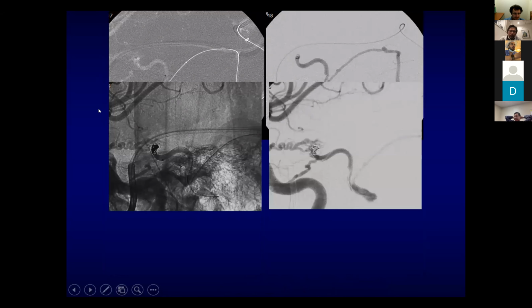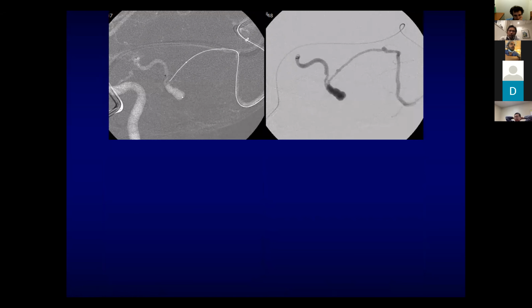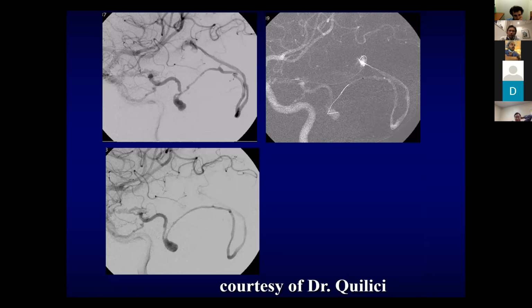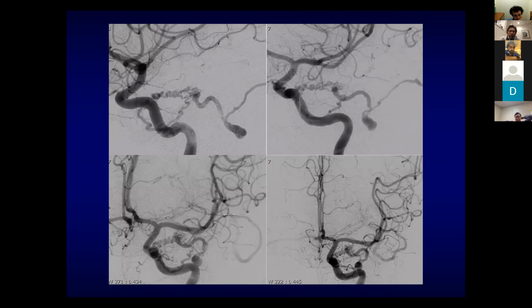And we know that happens pretty often with fistulas. The venous outflow gets occluded, and that's also probably Mac's case before of the tentorial fistula. It was probably the same thing. It could very well be, yes, of course. We don't have the proof of that, but it could very well be.